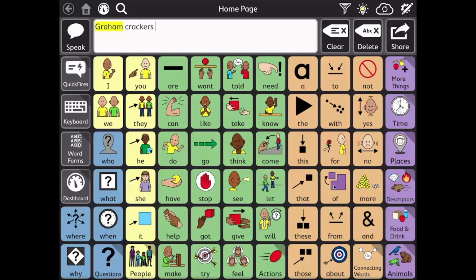So there it is. And that can be a really helpful feature, especially as you're helping learn the layout of certain words. But we don't want to linger there. We don't want to keep words hidden for a long period of time, especially when modeling. But it's a cool feature that is included within the motor plan layouts.